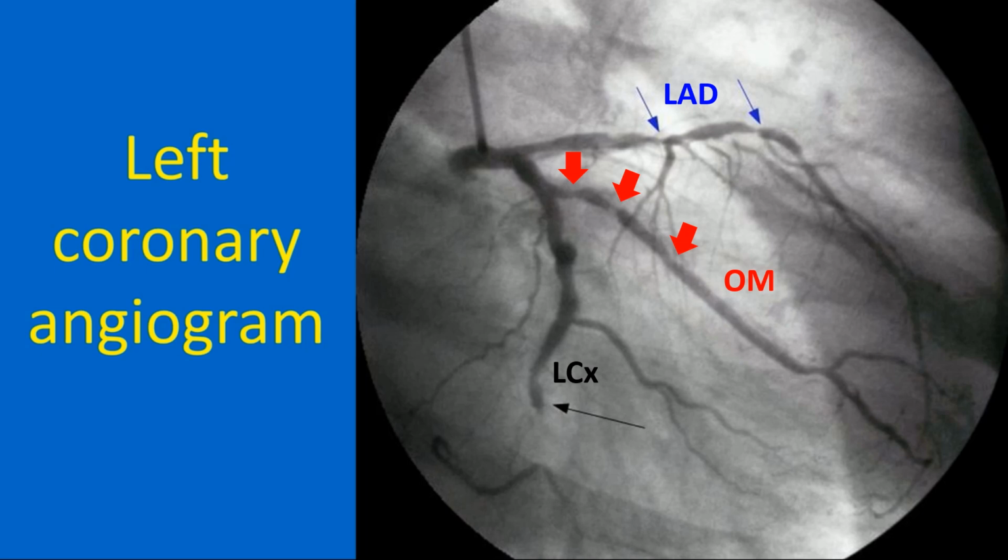Thus, what appeared to be a single vessel disease from the ECG showing hyperacute phase of inferior wall infarction with reciprocal anterior ST segment depression, which could occur due to isolated right coronary occlusion, has turned out to be severe triple vessel disease requiring coronary artery bypass grafting. The culprit lesion which has caused the infarction in this case is possibly the left circumflex occlusion.